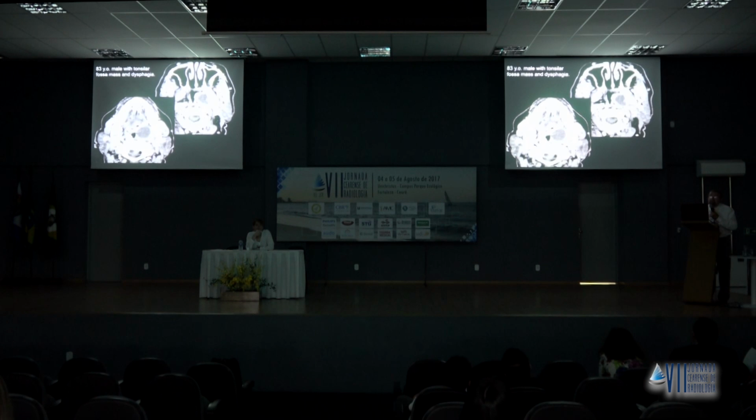Now, in the same area, you can see tonsillar abscess with a well-defined capsule. This is drainable. If you don't have a good enhancement in the wall, and you tell the surgeon that there is a retropharyngeal adenitis with abscess, they're going to go to surgery, and they're going to be very upset. So we always have to be very careful in calling abscess when it's only adenitis.